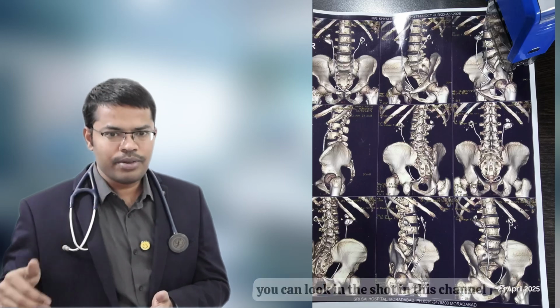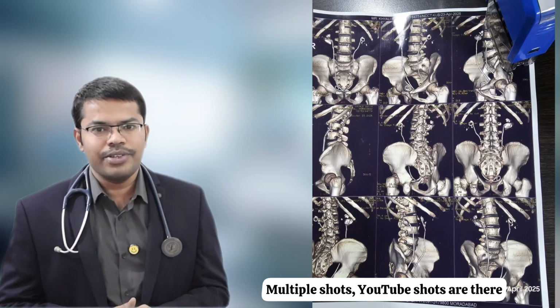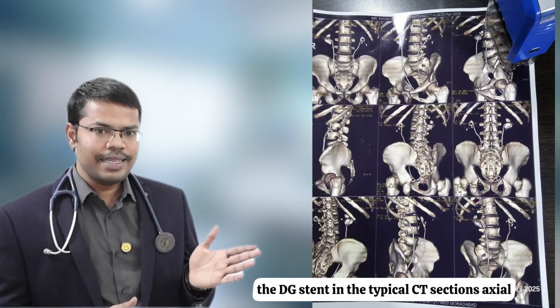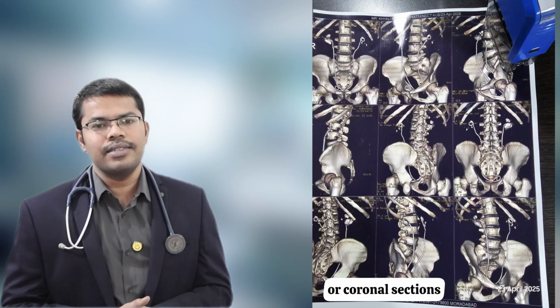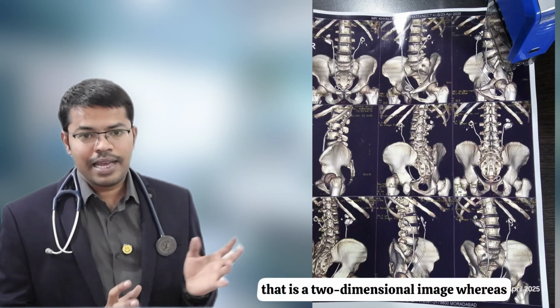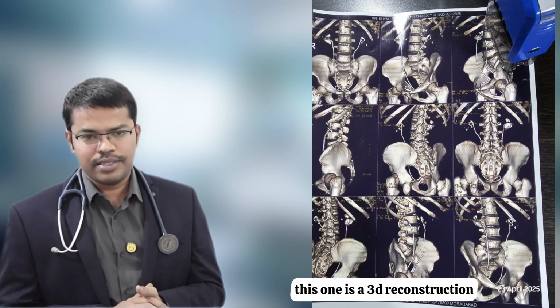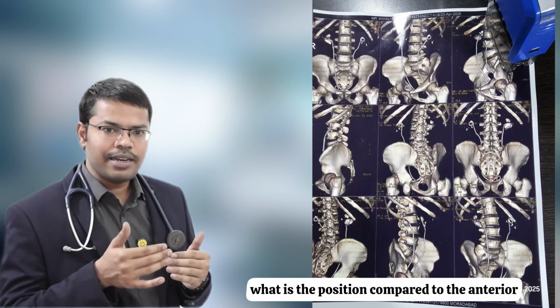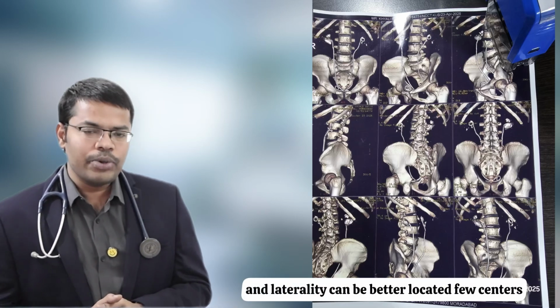If it is not appearing, you can look in the shorts in this channel. Multiple YouTube shots are there where you can see the DJ stent in the typical CT sections, axial and sagittal or coronal sections. That is a two-dimensional image, whereas this one is a 3D reconstruction where you can actually see the position compared to the anterior and posterior relation, and the medial and lateral locations can be better seen.